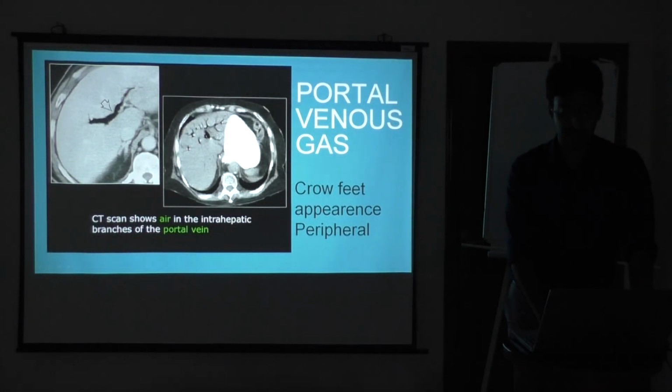You can see portal venous gas. Like I said, anything with air coming out is a good thing, but when it is in the abdominal cavity, in an abnormal area, it should be very bad. So you can see this. It's more of a crow's feet appearance.